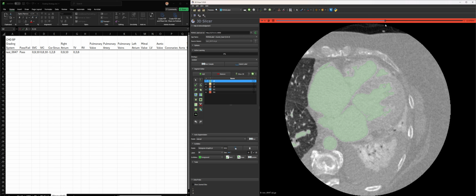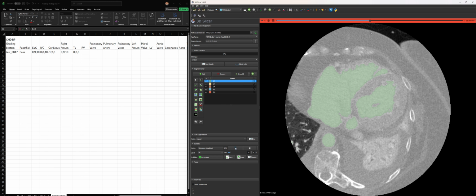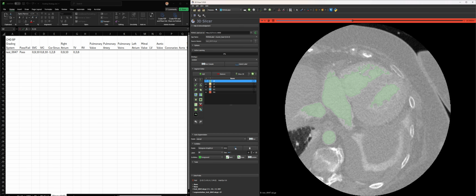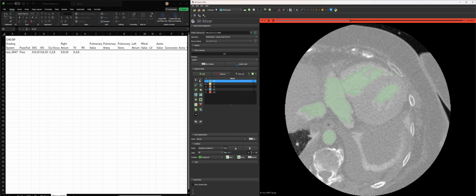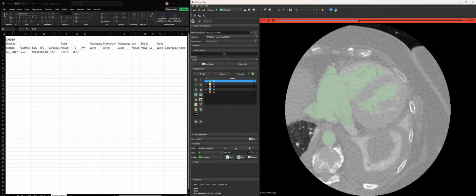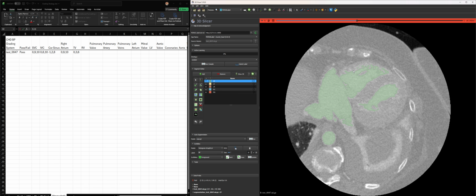We've already seen it on the 3D model, and you can always go back and look. It looks pretty good. There's a lot more opportunity for more segmentation, I think. It's pretty good. When I'm looking at the mask here, the thing I'm looking at is whether there's opportunity for more there.